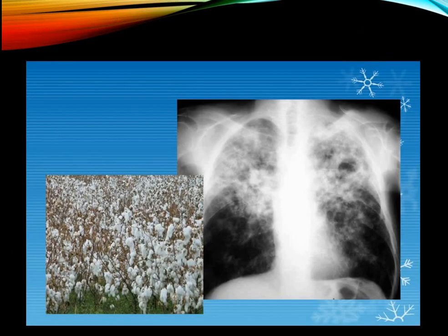In this chest X-ray, we have patchy bilateral opacifications at both lung apices, and the cardiac size is normal. This is mostly a bronchopneumonia rather than pulmonary edema. It's mostly pneumonia rather than edema. Number two, the distribution of this patchy opacification is in the upper zone.